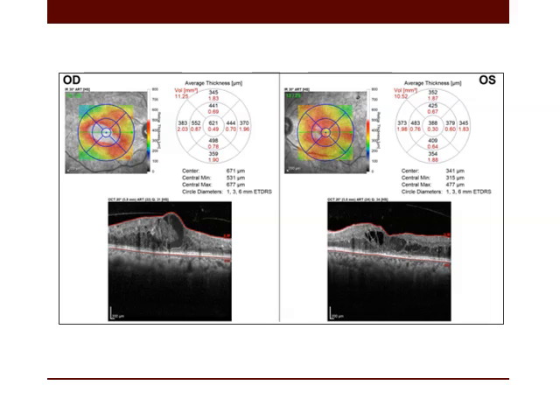Any volumetric scan will present you this figure, which consists of the 9 ETDRS regions. It consists of 3 concentric rings: the central foveal ring, then the parafoveal ring, then the perifoveal ring. The central foveal ring covers the central 1 mm and presents you with the average foveal thickness, or what's called the central subfield thickness. Then the parafoveal ring is divided into 4 rings: inner upper, inner nasal, inner lower, and inner temporal. The perifoveal ring is then divided into 4 rings: upper outer, lower outer, nasal outer, and temporal outer.